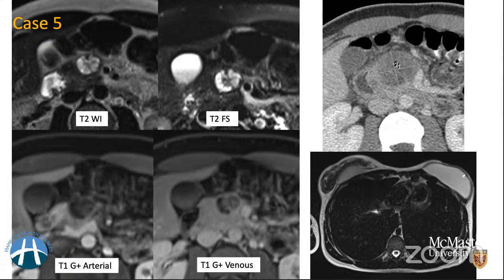And the final pathology is going to be interesting on this one. But again, this is something to bring to your attention: reviewing all images is really important. In this particular case, we then started thinking, okay, is it breast carcinoma, which can cause metastases, as some of you have pointed out in the comment section? That's really a great thought.